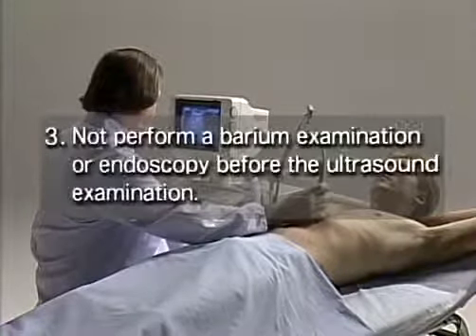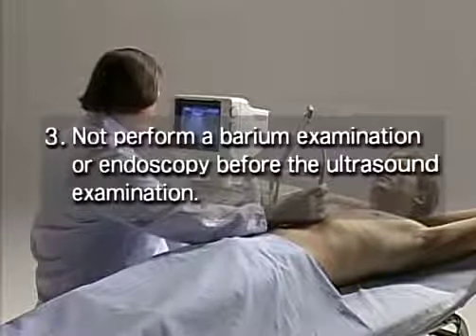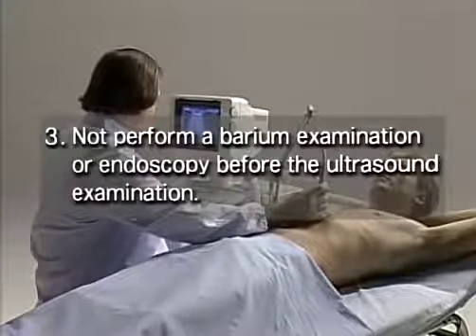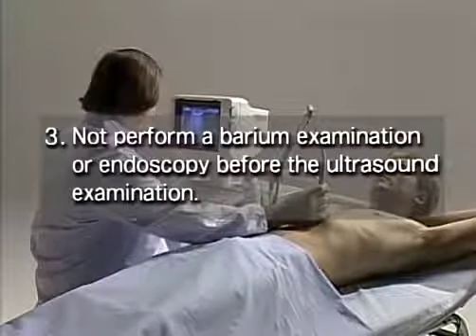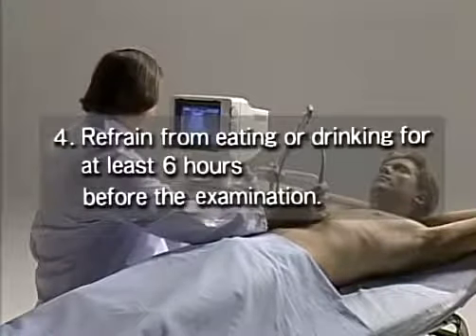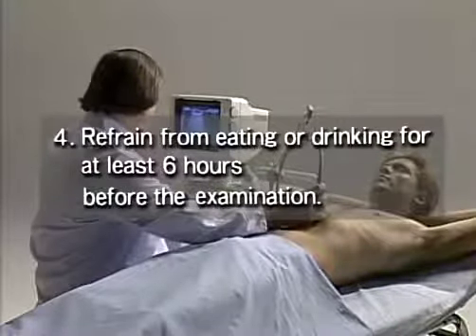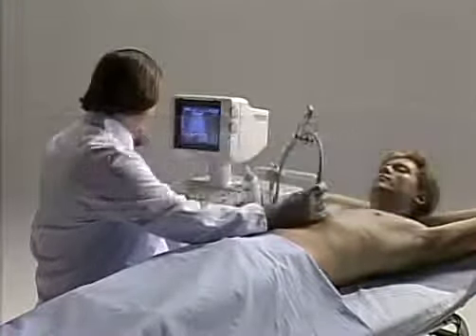When the ultrasound examination is performed in conjunction with gastric fluoroscopy or endoscopy, ultrasonography must be performed first. This is important because the barium taken for examinations of the digestive tract coats the gastric and intestinal walls, making ultrasonography impossible. If it is necessary to carry out an ultrasound examination in the afternoon, the patient can have a light breakfast, but must refrain from eating or drinking for at least 6 hours before the examination.